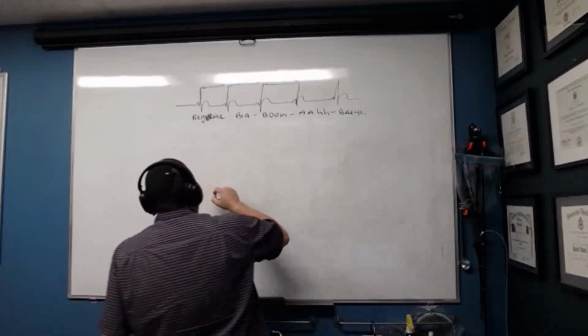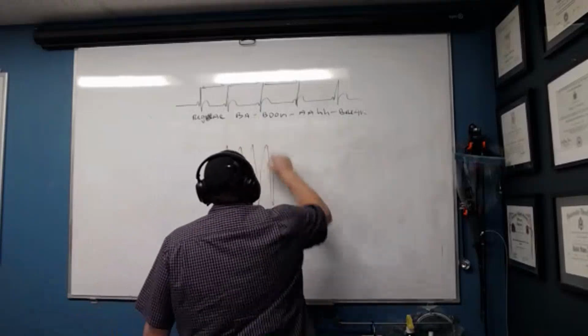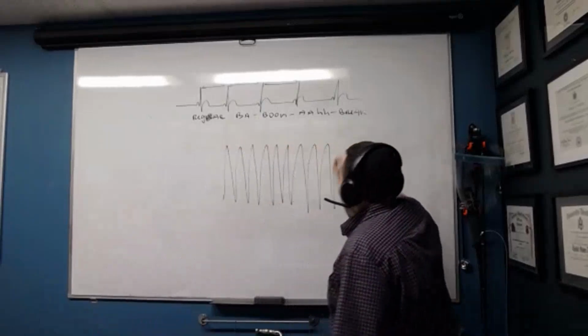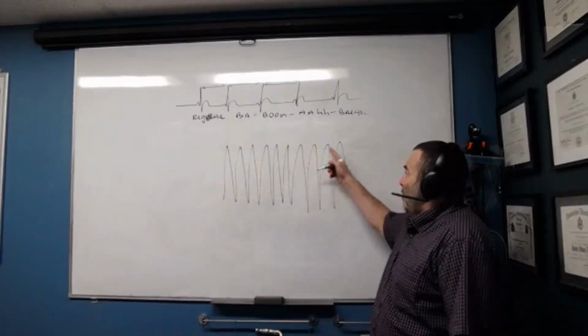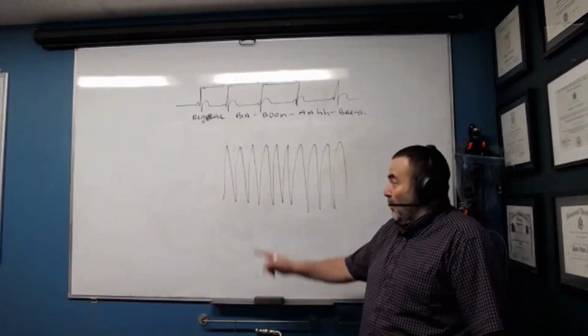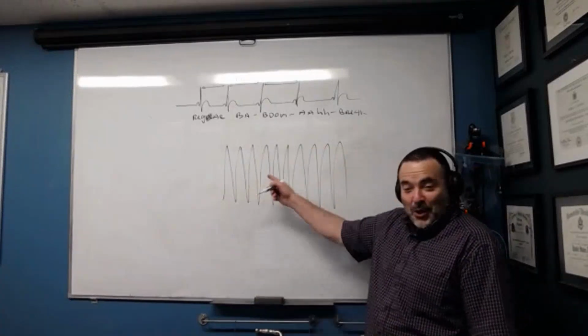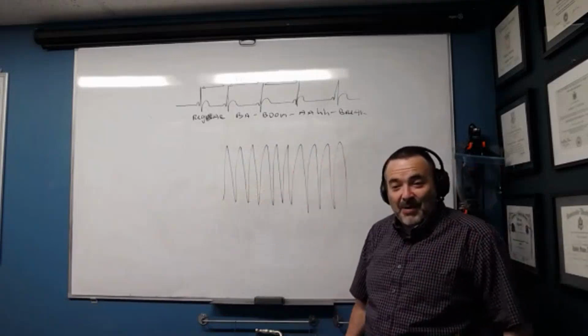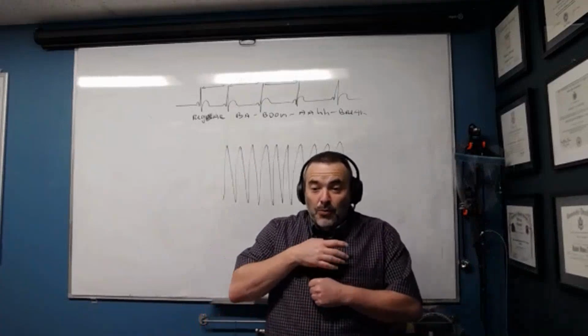What if you were to come in and instead of all the ba-booms, you would see just this? How do you like that rhythm right over here? Boom, boom, boom, boom, boom. Well, that seems to be a problem. Don't you think? It's just a whole bunch of boom-booms and everything else is not happening. There's no ba-boom break.